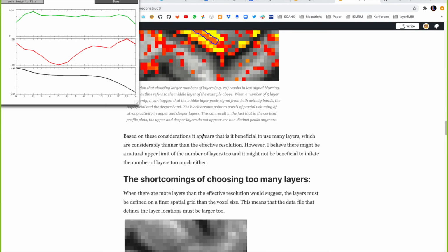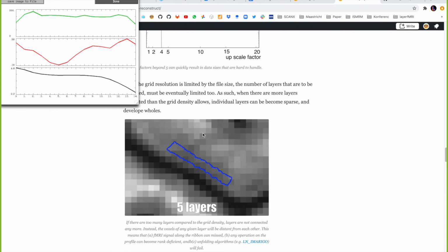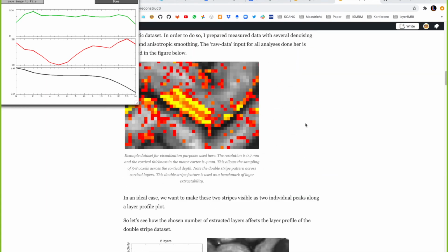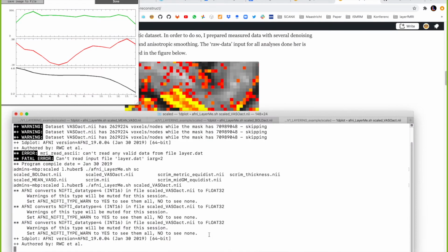Any questions from anyone? Or maybe a part that you didn't follow or understand? I have a question. So far, you've just drawn a single layer or rim profile on a single 2D slice. If you did it in 3 dimensions, so if you did layers across multiple slices, would everything still work, or is there a different processing stream needed?